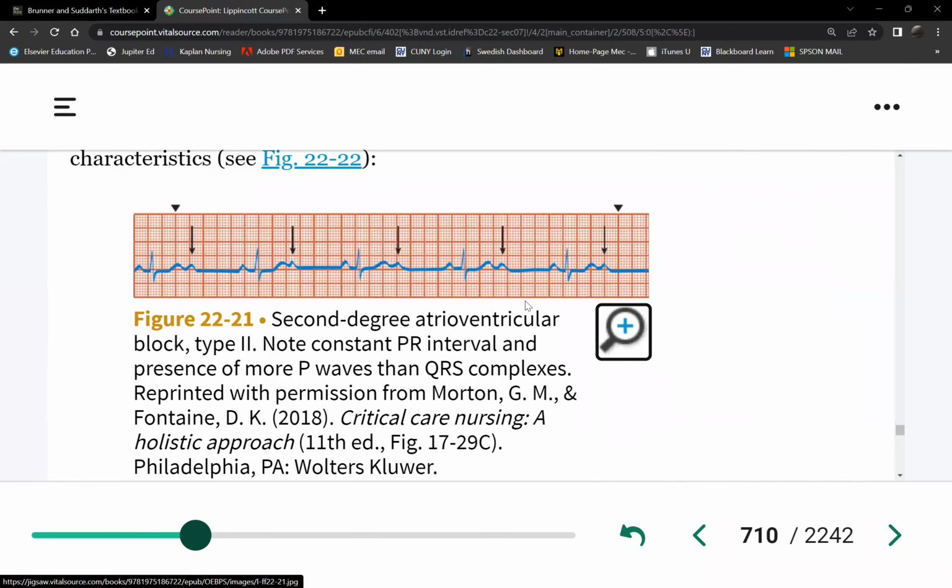So here the heart rate drops, right? Okay, so what's your estimated heart rate here? Just count really quickly. These are your 3-second markers here. 3, 6 seconds. So it's how many? 1, 2, 1, 2, 3. Not even 50, like in the 40s. Okay, it's already in the 40s.